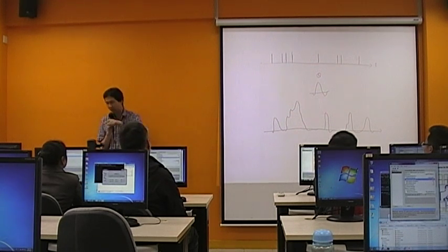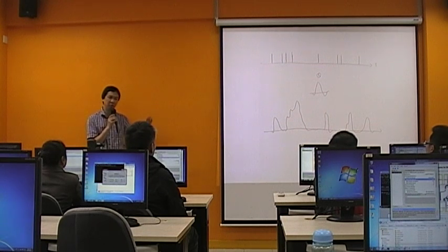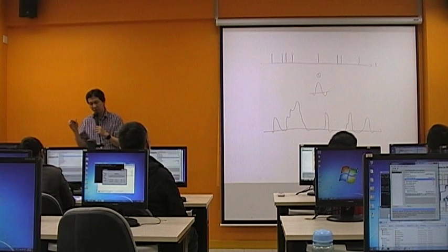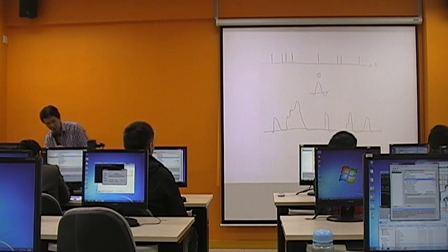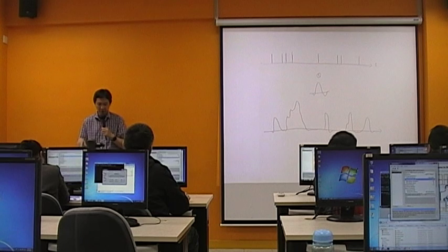So this is one setting that tells if you have done slice time correction, every single slice is starting at the same time point, or is adjusted to the same time point, which is the middle of the time. You could do something with this, but normally people don't really worry about that. Anyway, this is just for you to understand what is happening.